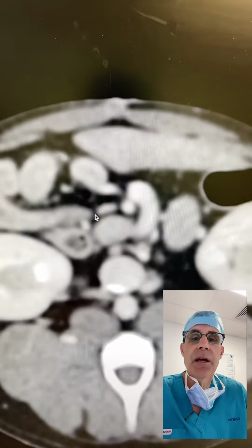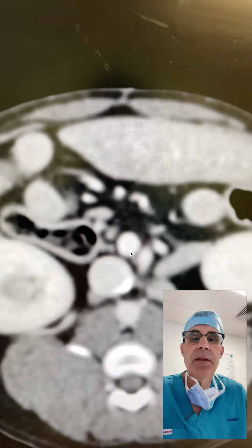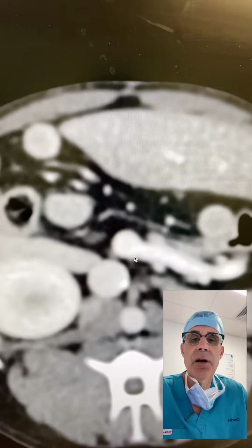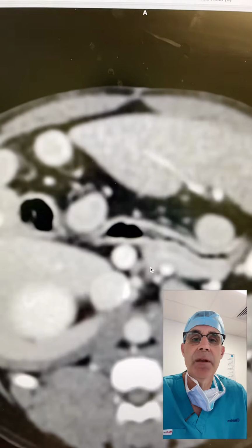And so if we watch that carefully, coming forward, we've got the portal vein and the vena cava are very close together, right there and right there. And we keep heading cranially. We can see other branches coming into the portal vein. That would be the splenic vein coming in there.